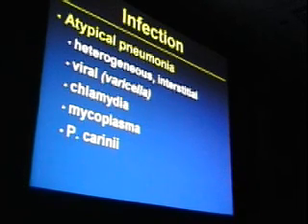These are typically caused by viral organisms. So I put varicella in parentheses, and I want you to put a star by that, because usually varicella, when you see it on a chest film, looks more nodular. The nodules are typically 5 to 8 millimeters in diameter. I don't have time to show you all of these cases, but I'll put this star by that.